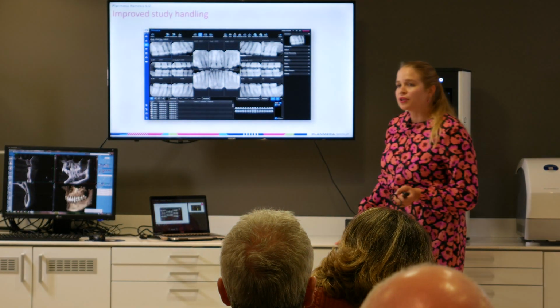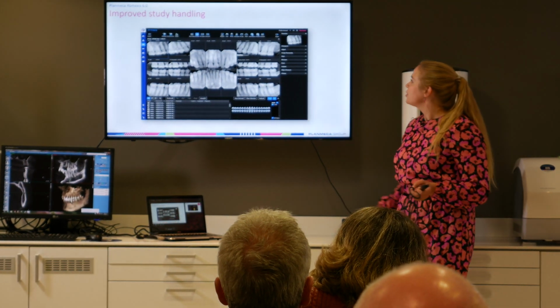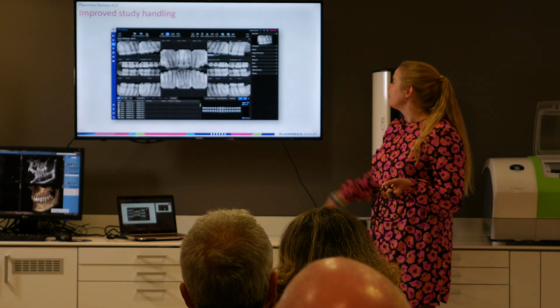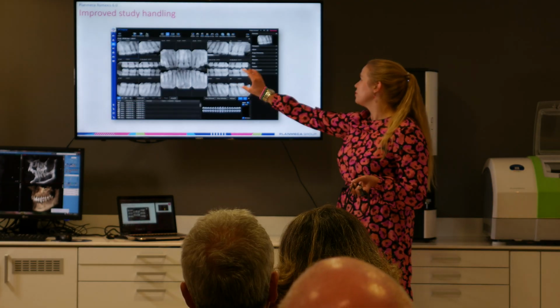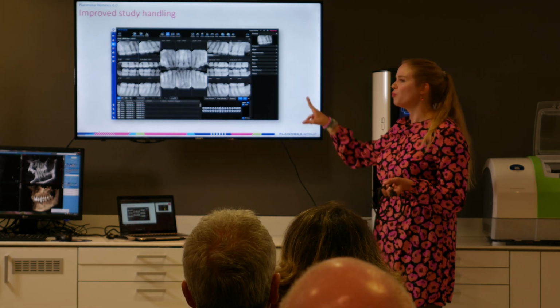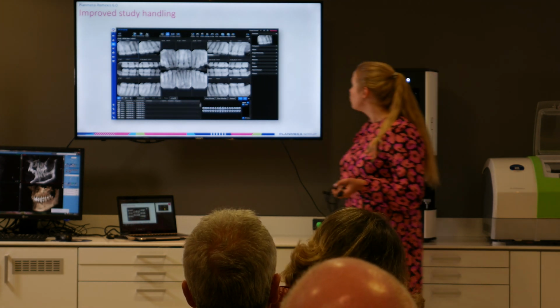And if we would be working with the studies with 2D image collections, we have made some improvements to those also. We can now compare two studies with each other. We can have the studies also as image files, just like the others. Maybe you saw in the earlier videos how you can see the studies just like any other 2D image. So you could open them with just one click from there.